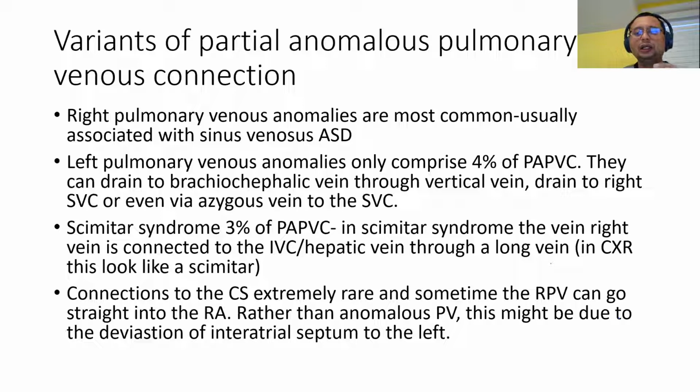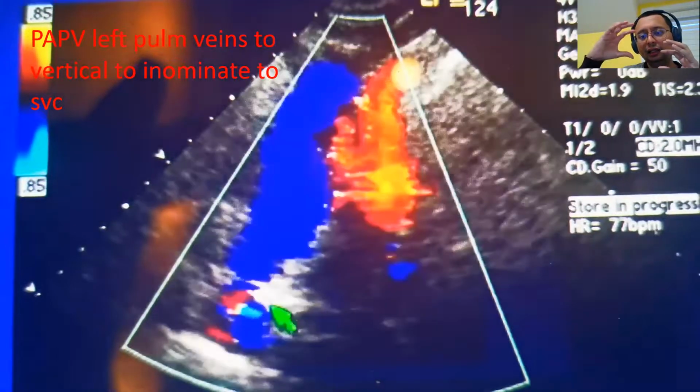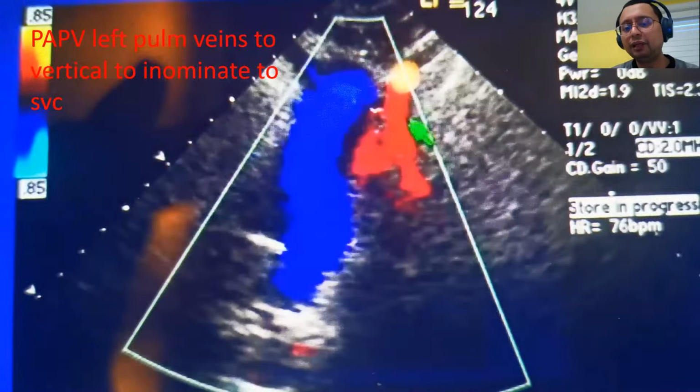You just remember the basics of anomalous pulmonary vein. One partial anomalous pulmonary venous drainage is not associated with ASD. Usually you can leave it alone, say if you have a single partial anomalous drainage, or even two, unless you have right-sided dilatation. So this is an example of someone with anomalous drainage of the left upper pulmonary vein.